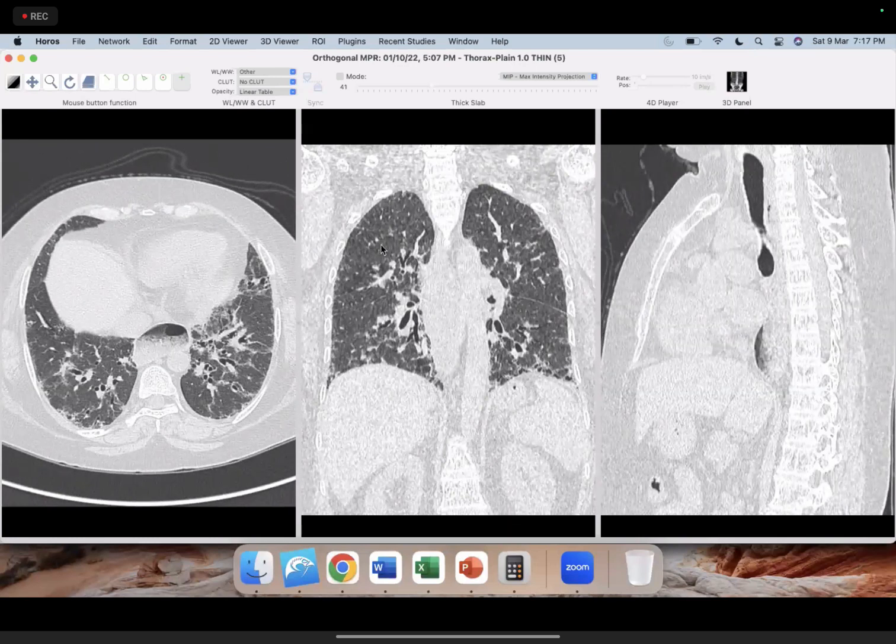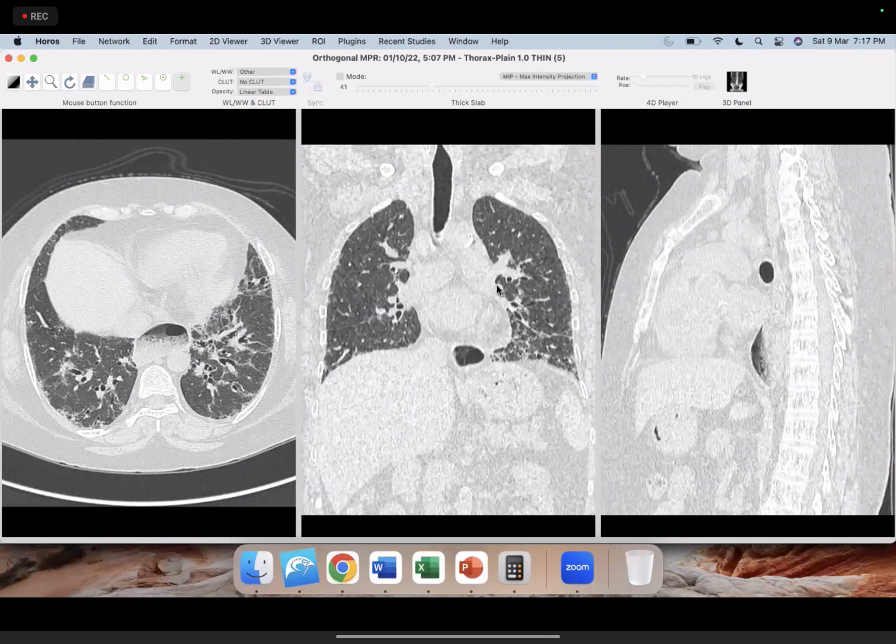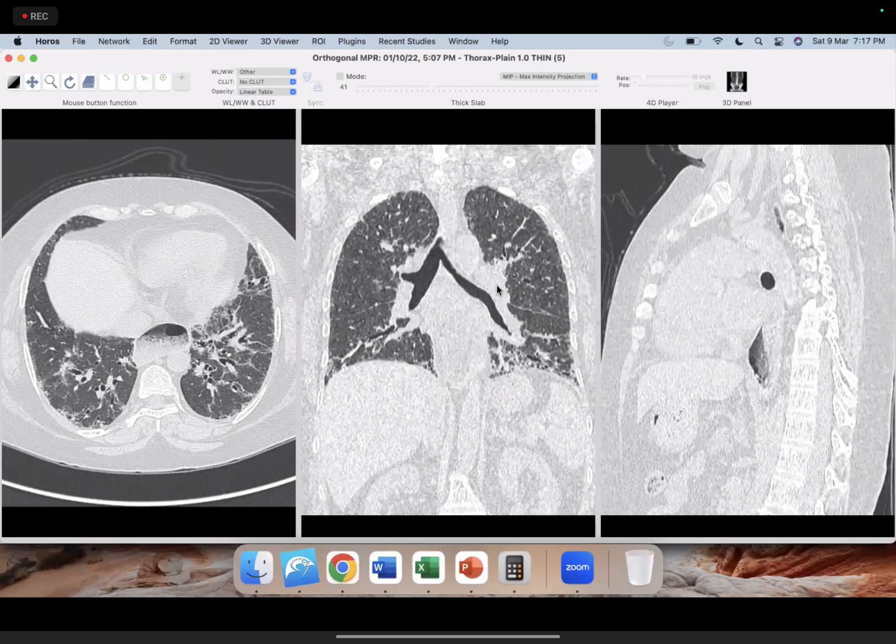Yeah, many of you have already said scleroderma because we see this dilated esophagus. So remember NSIP, though it's one of the idiopathic interstitial pneumonias, IIP, right? After UIP comes NSIP. Typically, we do not label any NSIP pattern in an idiopathic scenario.